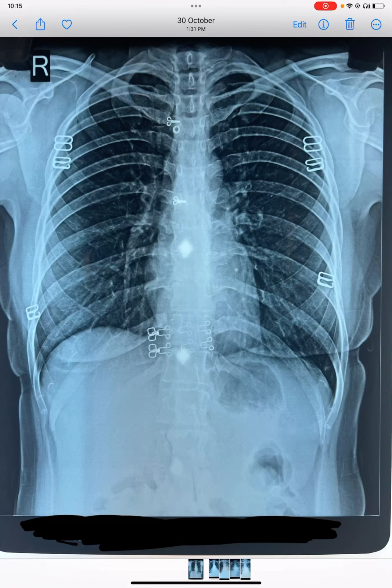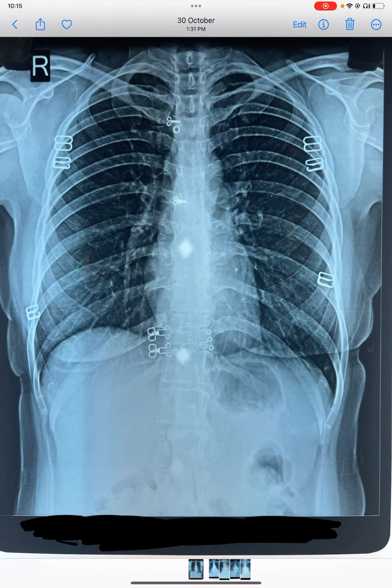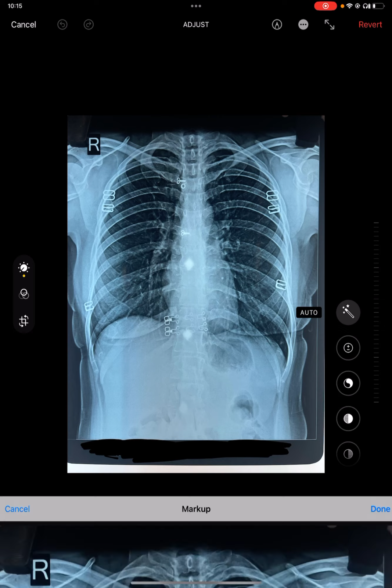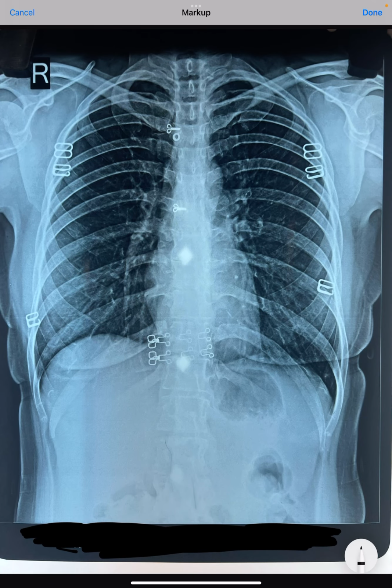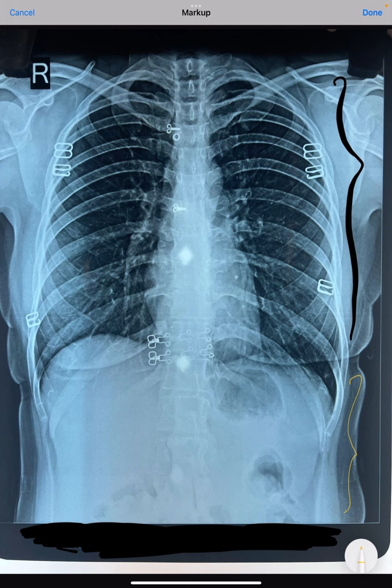Now today we'll be discussing so many X-rays. This is a typical chest X-ray, and what we need to see is very easy. In this, a large amount of thorax is visible and much of the abdomen is also visible. So this is all abdominal, this is diaphragm, and this is diaphragm.